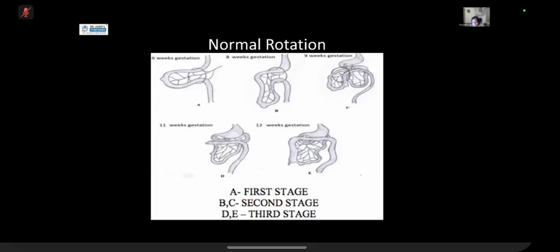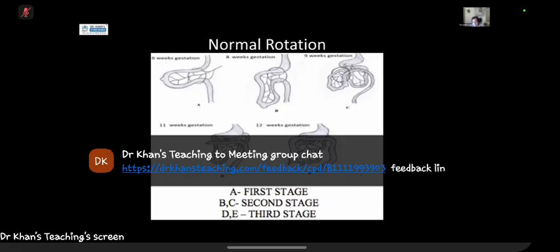Duodenum redundant is essentially where you've got excess, or rather a redundant, duodenal loop in the first superior part of your duodenum. So you're thinking the first part, or second part. They talk about an elongation of the duodenal cap. On your upper GI contrast study, you don't see the classic shape of your D1. You get a bit more wandering, with more duodenal loops in that region before it finally goes across the spine into the normal expected position of your DJ flexure.